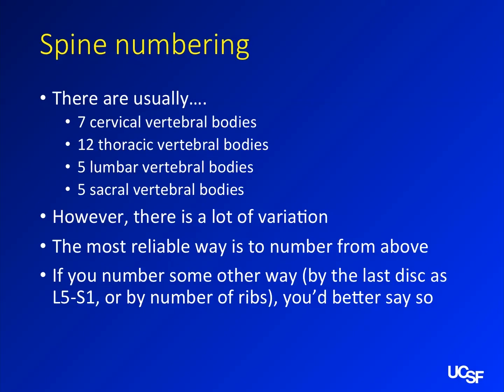One way that you can get sued as a radiologist is if you call a disc or a tumor at the wrong level and the surgeon does a wrong level surgery. You're going to be there in the defendant's box with the orthopedic surgeon. Many times we don't often start at the head. Sometimes they do these numbering sequences and you see them at the top, but you don't always have that. So you use other things to number them.